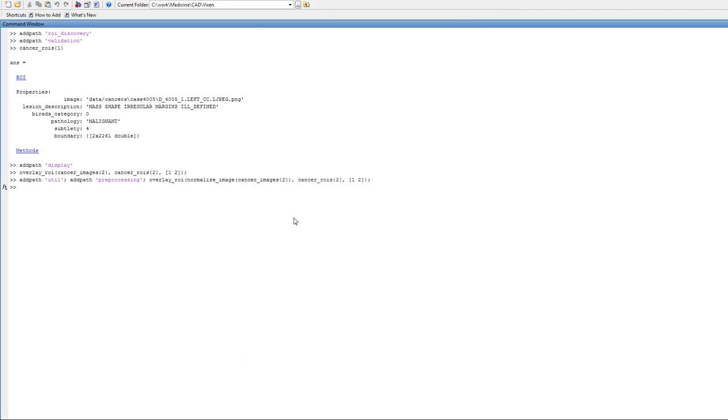And now let's see what happens when we attempt to diagnose the image. So I have a few of these, and what I'm going to do is show you the images themselves, and then we will run the region of interest detection algorithm. That will take about 15 to 30 seconds for each image. And what that will do is highlight the regions that we've discovered that look suspicious. Then we'll pause for 5 seconds and do it for the next image.